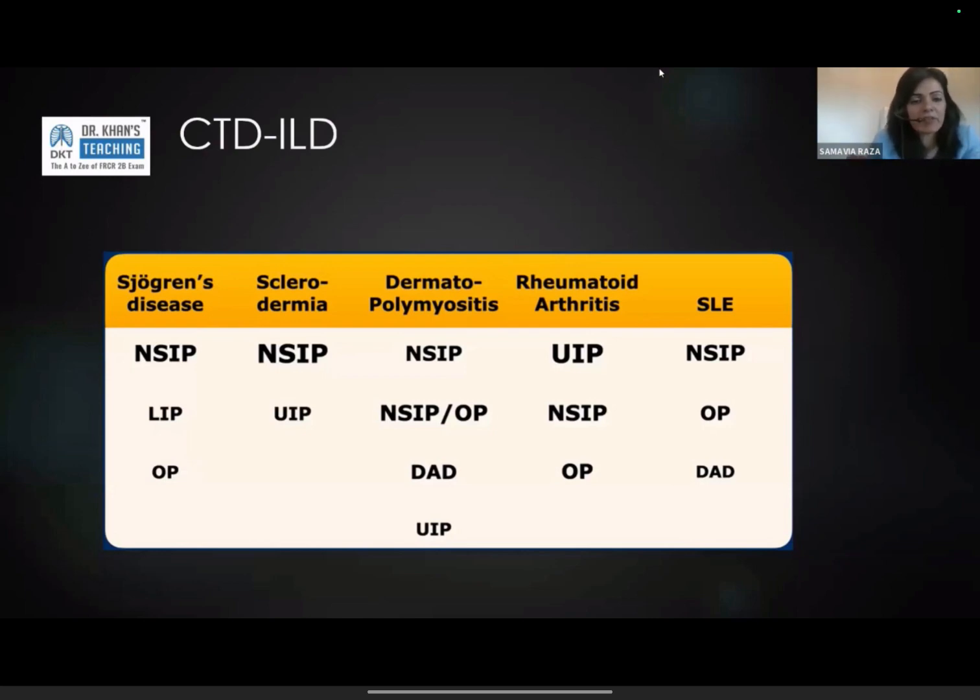SLE is very heavily pleura based. So when you think SLE, remember effusions, pericardial effusion, pleural effusions, pericardial thickening, pleural thickening. SLE is the one that goes towards the pleura. RA also gives pleural effusions, sometimes pericardial effusions. These are the ones that you need to think of, especially from an exam point of view. The connective tissue diseases that like the membranes, pericardial, pleural, they can be thickened, but very mildly, barely perceivable thickening on scan. They can be slightly enhancing, but fluid is what you're looking for. Scleroderma, Sjogren's not so much.